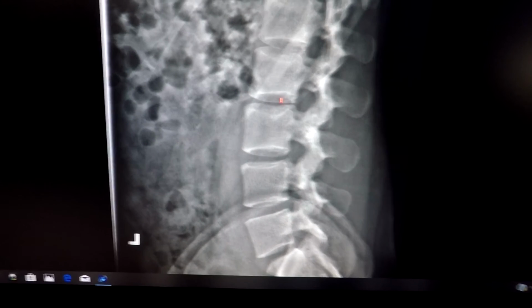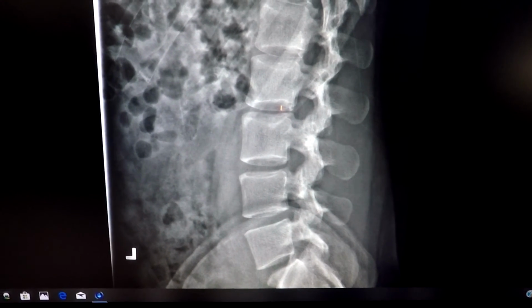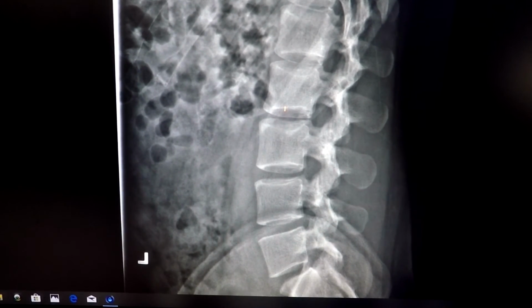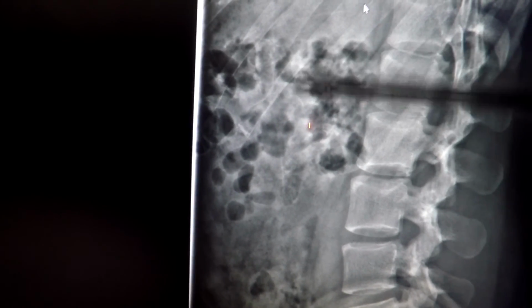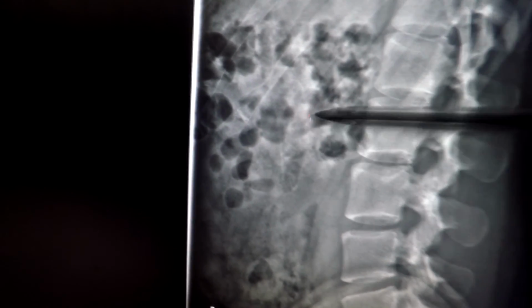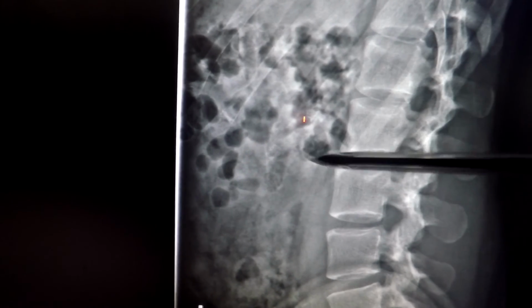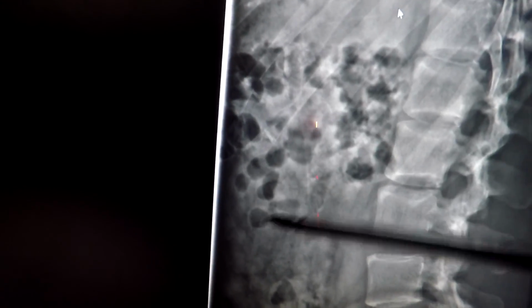So here's what's abnormal on this X-ray that I'm going to tell you about, that you wouldn't normally think of as a chiropractic kind of problem, but it is. This is all his small intestine. This is a lot of gas. When you see dark black circles in there, it could mean other things, but for the most part, in this particular case, what you're seeing there is a lot of gas.